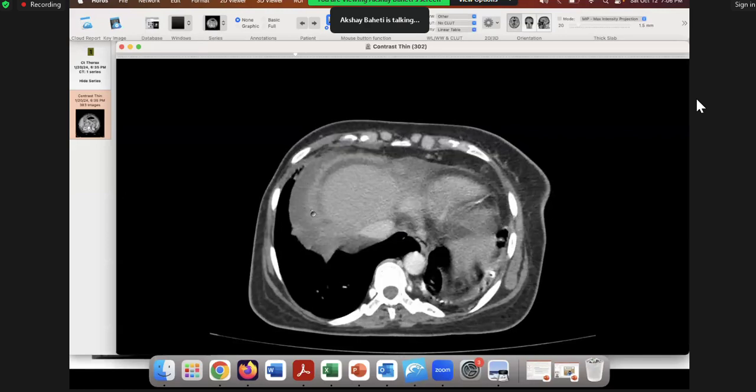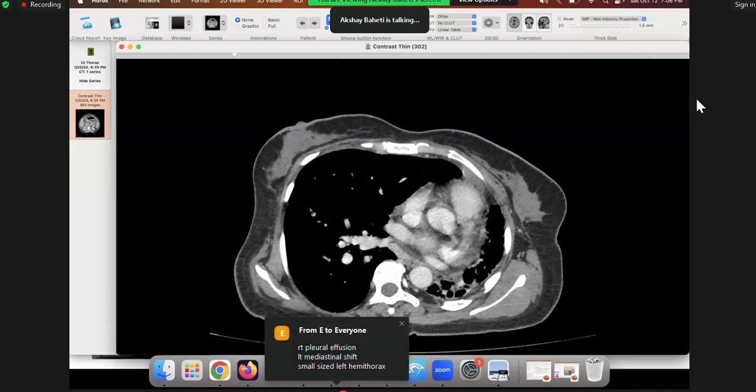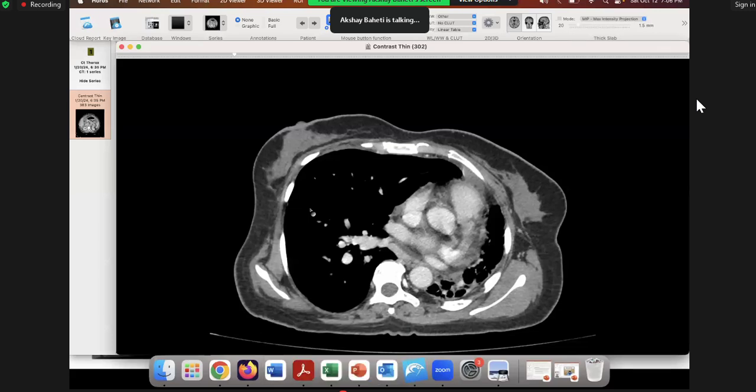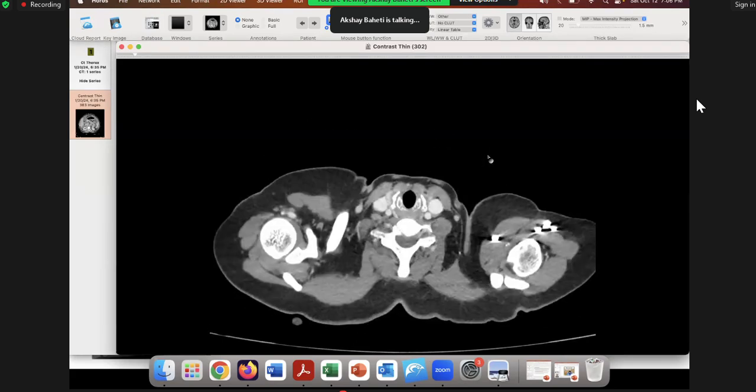Okay, so one thing you remember with ovarian cancer, Aparna, the most common sites of mets are two actually. We all know of peritoneal spread. The other thing is nodes. Okay, so ovarian cancer very rarely will go to liver or lung parenchyma. You won't see visceral metastasis per se, but like all other carcinomas, it does go to nodes. So the two common sites for ovarian cancer are always going to be nodes and peritoneum. Okay, so now keep that in mind. I'm going to scroll again and now search for nodes. All right.